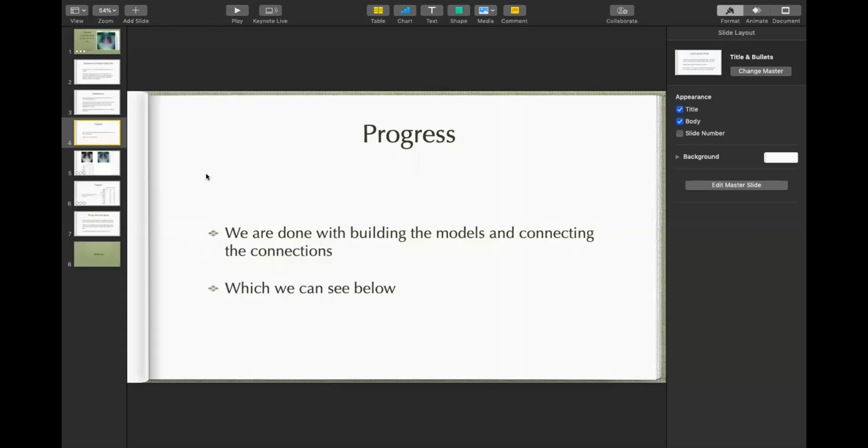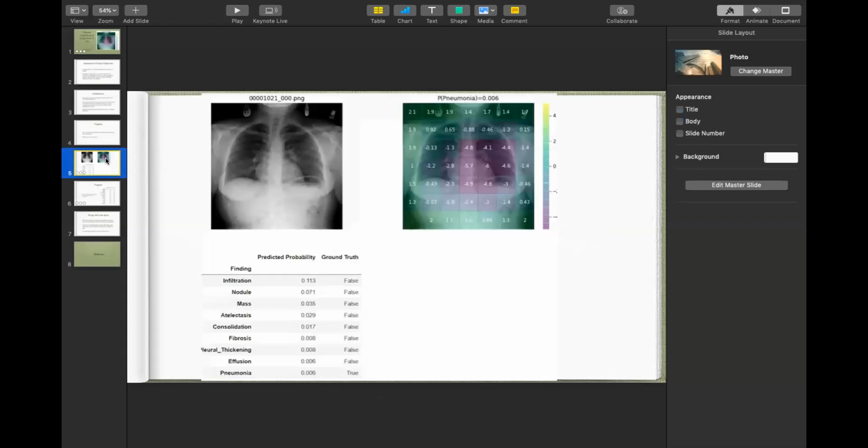My friend Rahul has already discussed this, but I will make it a bit clearer about how the visualization file helps in a layman's manner. We have uploaded this as a PNG file. A chest X-ray would actually be in a very different format or extension, so we have converted it into a PNG file, converted it to grayscale and then to an RGB file, and we have overlapped the correlation matrix over it. If you see the region over here, this is the most probably affected region of the X-ray, where there is pneumonia.